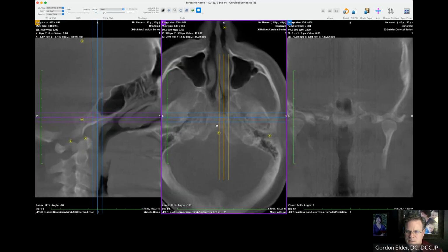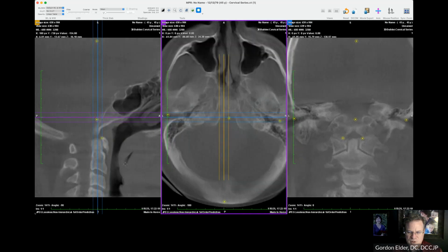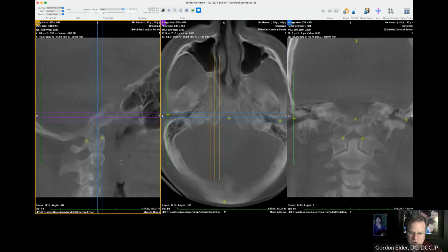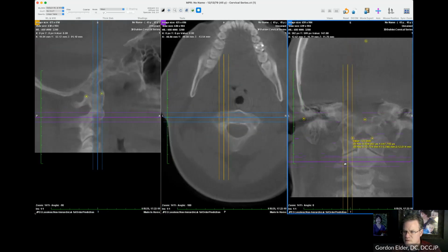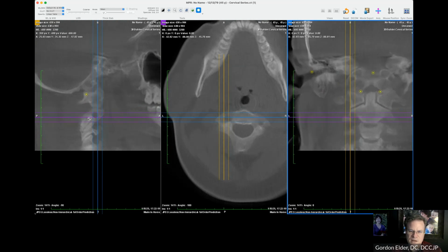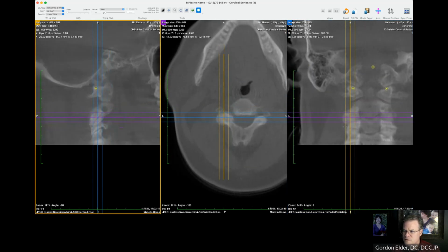All right. These particular joints we measure to the ground. So I'm just going to leave this there. We're going to go look at C23. There's the joint. There's the joint. There's the joint. Okay. And the first thing before analyzing it, just because everything is still lined up, I'm going to measure it.